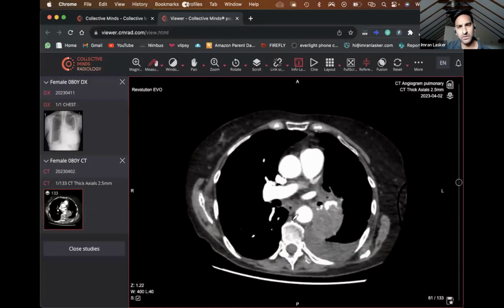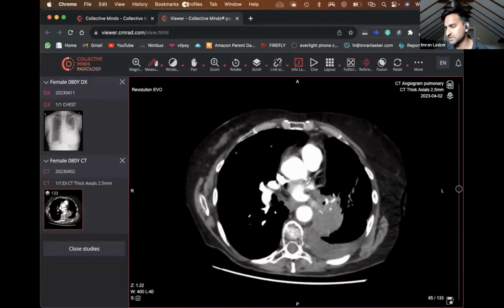But actually, when you look at this particular CT, you can see a little bit of a lip like this, and that looks like pleural fluid. You can see there's almost a difference in density between this area over here and this area over here. This looks slightly more hyperdense than this. Also, if this was fluid just sitting on the back of the chest like this in a barrel, then surely all the fluid should be like this, shouldn't it? Rather than having this almost different mass-like area sitting within the region of the hilum.